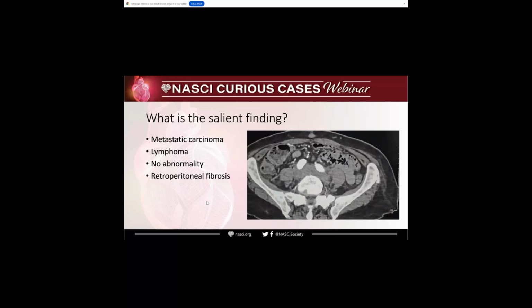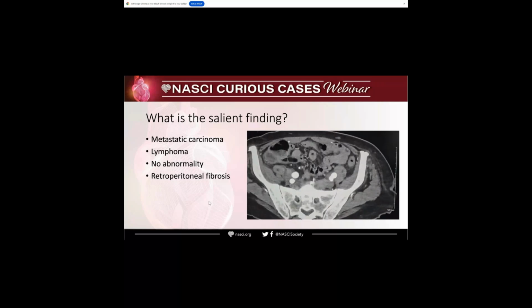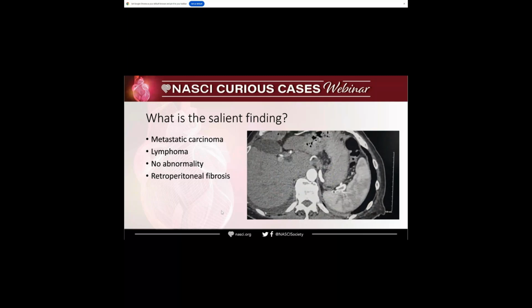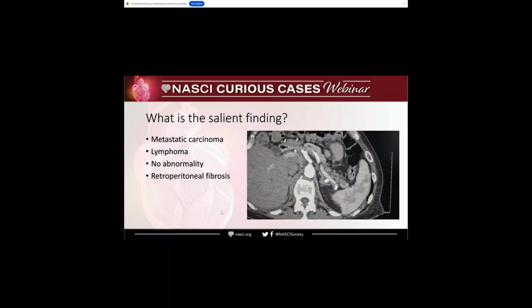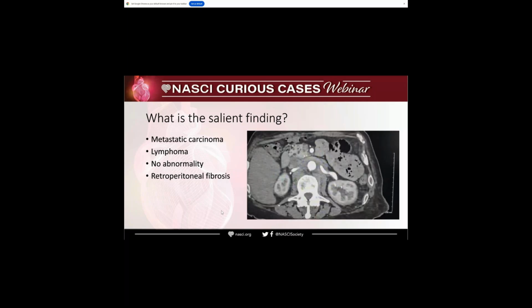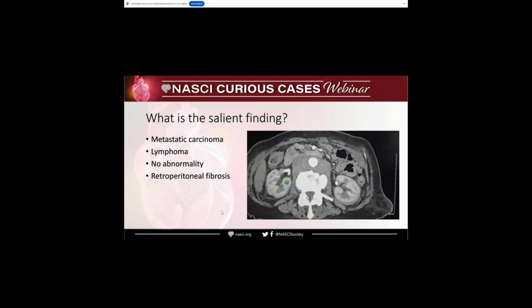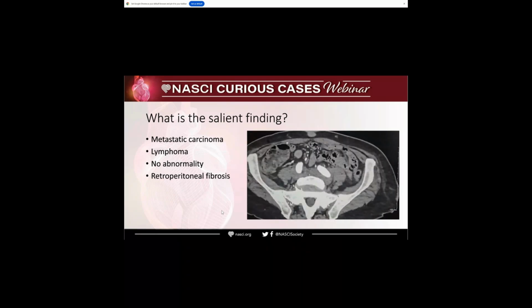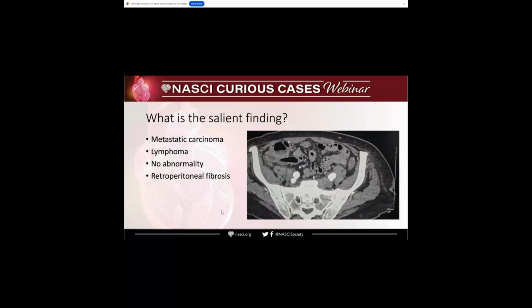Sorry. So you kind of see hairy kidneys. I don't know. So seeing the perinephric findings, I guess you could say, I still personally would report it as retroperitoneal fibrosis versus lymphoma. I don't see everything, but is this an older gentleman?